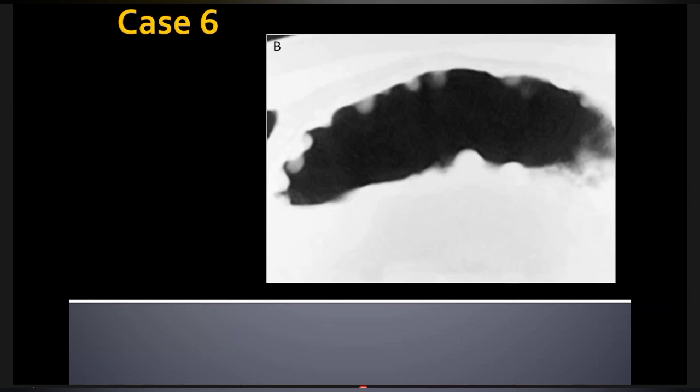Talk to me about this image. Ma'am, in this spot image, which is provided to me, I can see that there are smooth indentations along the walls of the stomach or intestine. I can see that it might be the small intestine. It's the stomach. Okay, it's fine. I guess these are the smooth indentations along the walls of the stomach, which are not filled with contrast, which are not filled with air, and they are smooth lined.